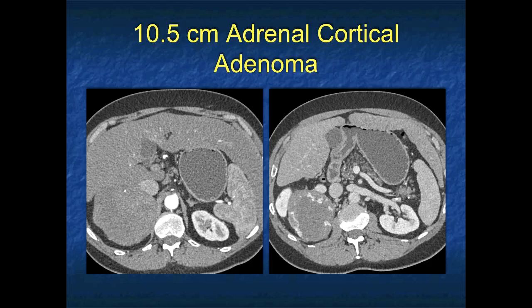Well, the one thing I wouldn't have thought about was an adenoma. This was a large adenoma. We talk about adenomas, the most common adrenal lesions. They're low density, under 3 centimeters. Sometimes they can be large, and sometimes they can mimic a primary ACC, as in this case.